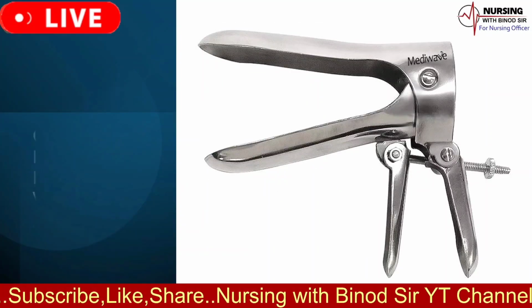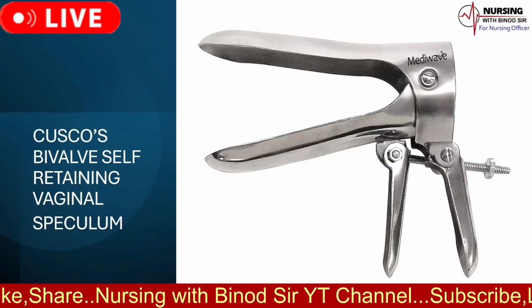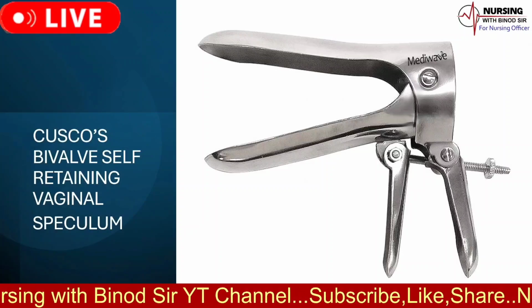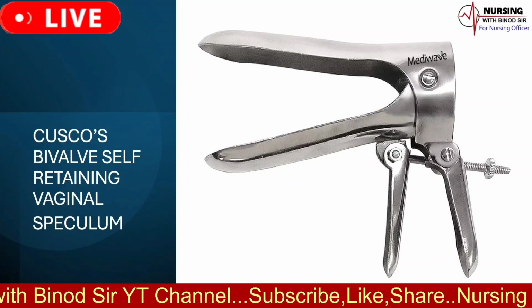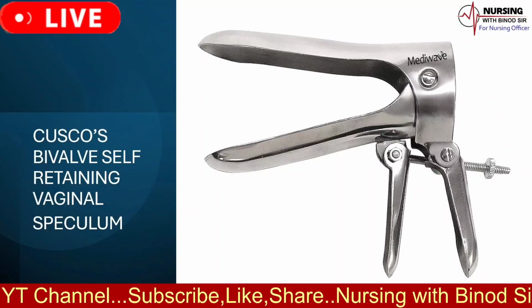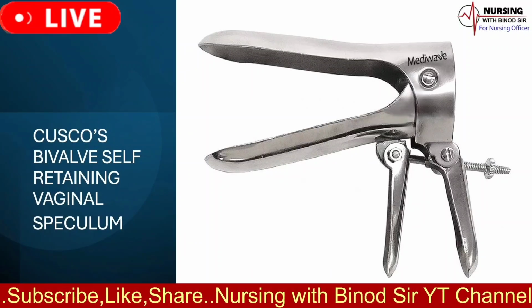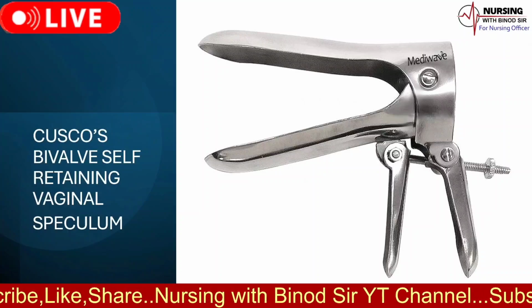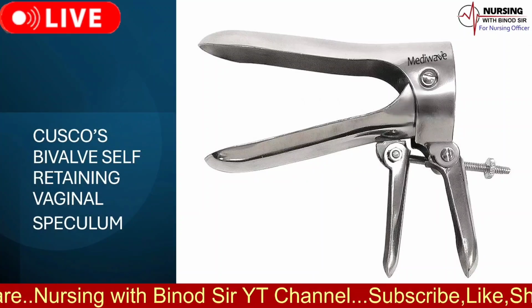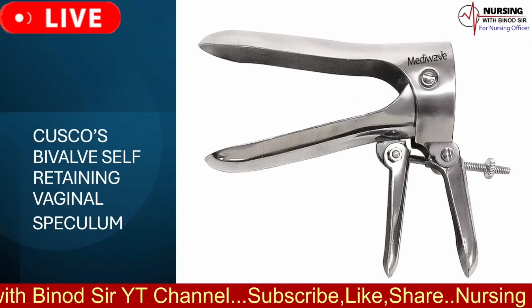The name of the instrument is Cusco's bivalve self retaining vaginal speculum. The uses of Cusco's bivalve self retaining vaginal speculum are as follows. 1. To visualize the cervix and vaginal fornices for any local cause, polyp, ectopy, of APH. 2. To inspect the cervix and to prepare cervical smear for cytology screening. 3. To detect leakage of liquor from the cervical OS in a case of suspected PROM.